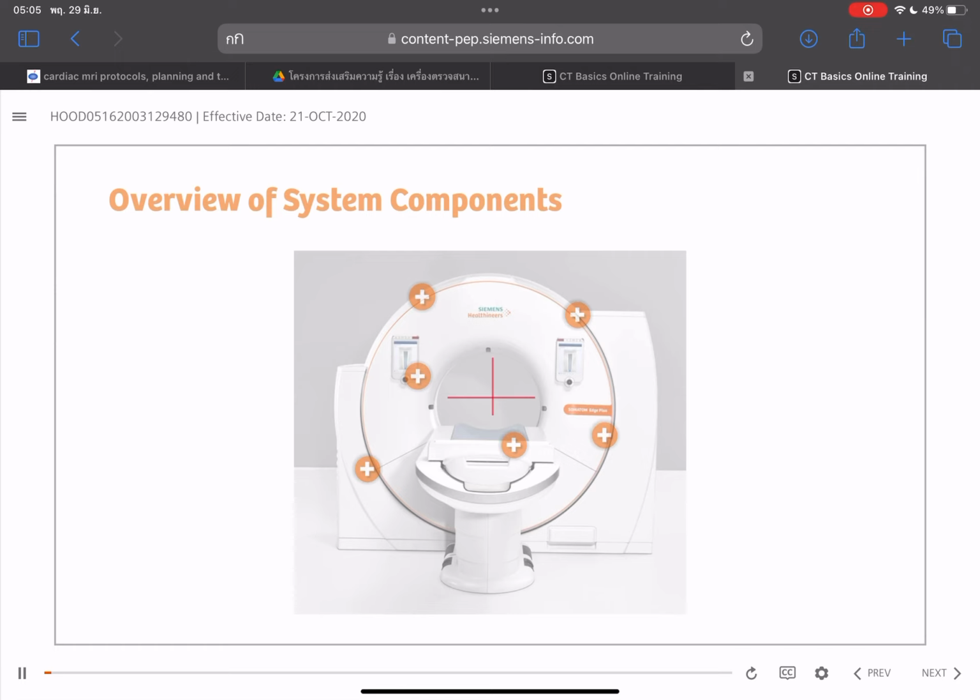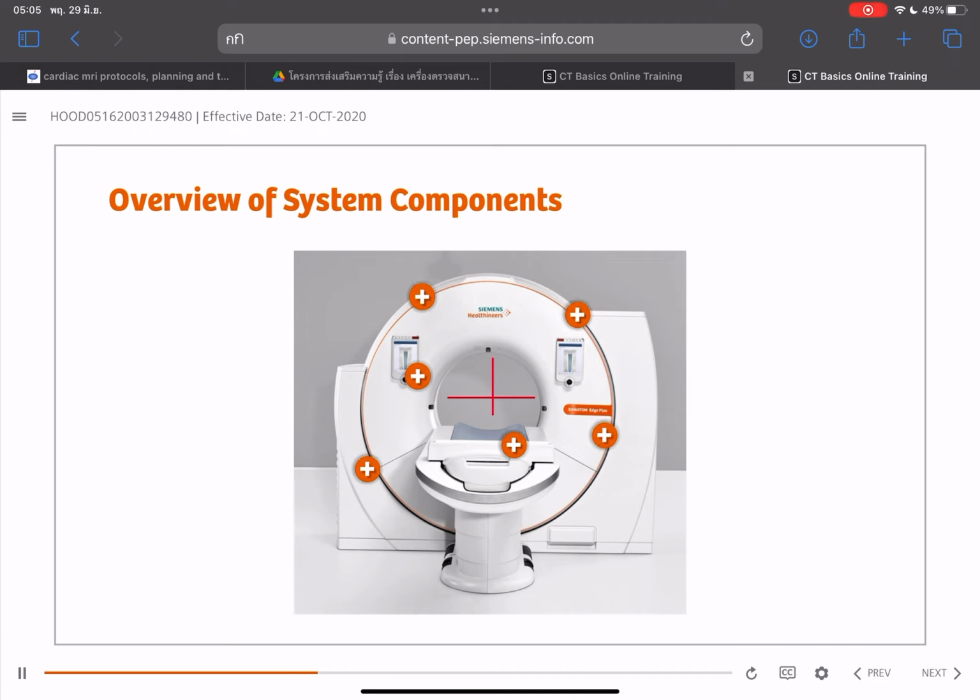The computer tomograph consists of a stationary and a rotating part. The rotating part contains the X-ray tube, detector, several filters and fans, and electronic components, for example, those associated with the data transfer. The stationary part includes further electrics, connections for power supply and cooling, and, for some scanners, the tilting mechanism. The patient table, also called patient handling system, is mounted in front of the gantry.